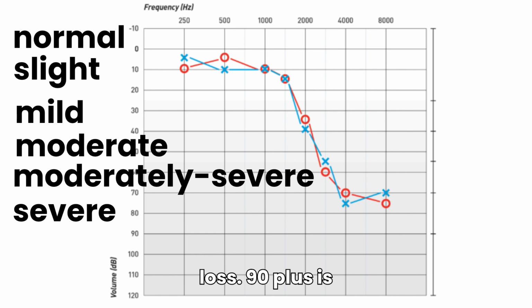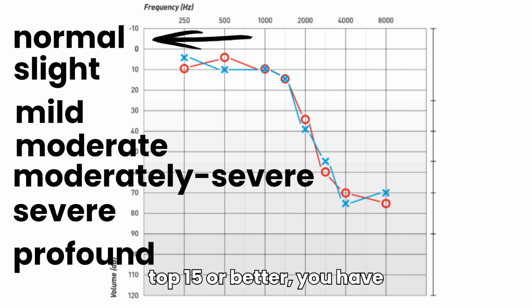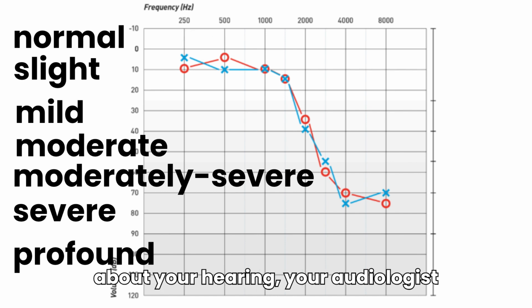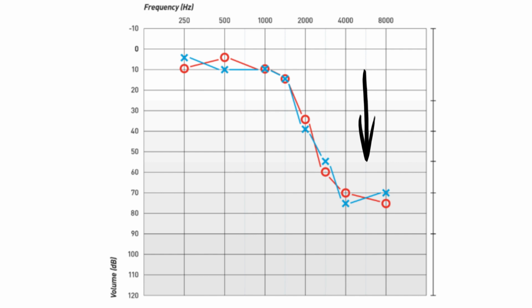90 plus is profound. So if you see all the X's and O's right at the top, 15 or better, you have normal hearing. If you're not worried about your hearing, your audiologist likely isn't either. If those X's and O's are below that, you have some amount of hearing loss.